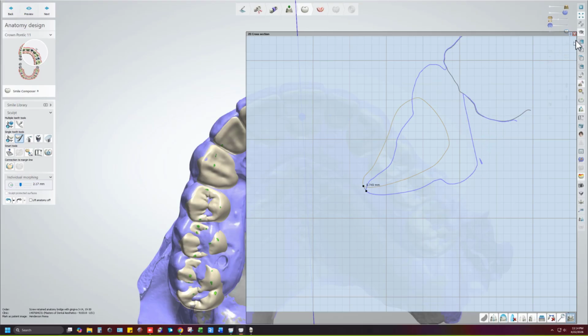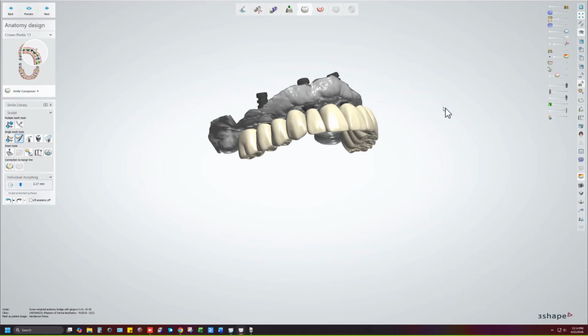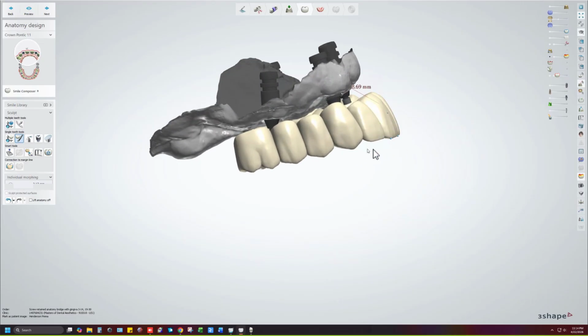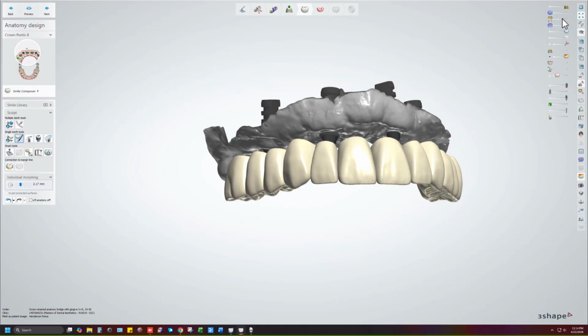That's a big no-no to begin with. So that'll give us a better roll into the tissue. And you can already see where it's going. You see the trajectory right here. This is coming and it's going to land around here, right? So we're good. That's the upper.